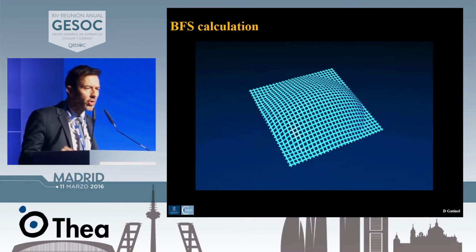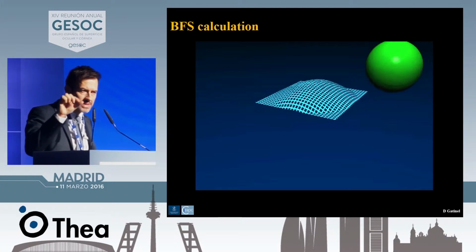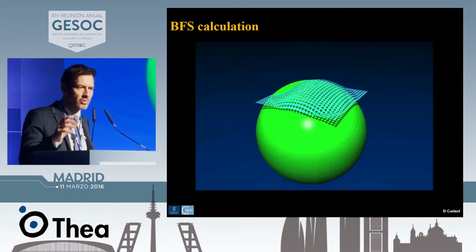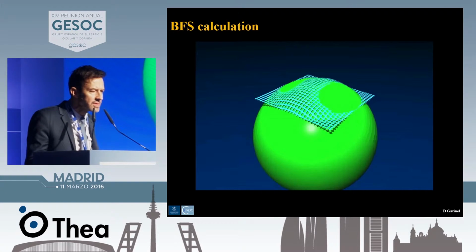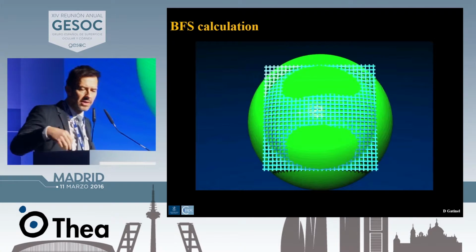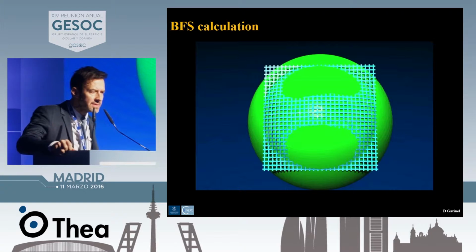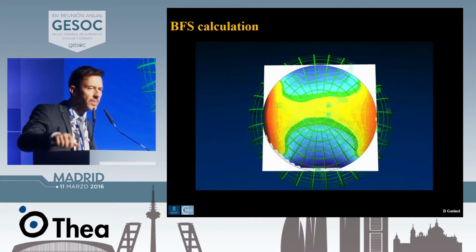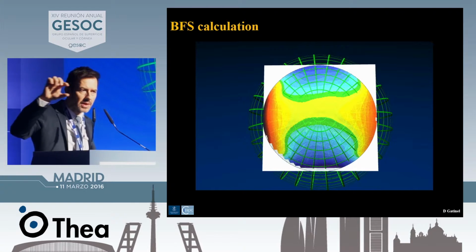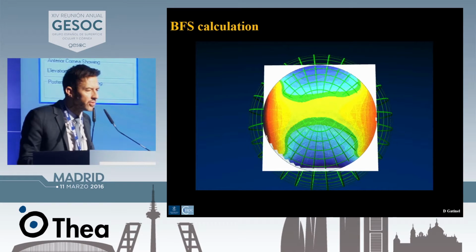If you have the shape of the cornea, the problem is to show it to the doctor because the differences are very small compared to the macroscopic shape of the cornea. This is why the best fit sphere, BFS, is always used to show elevation. Sometimes you can use other surfaces, but once you have found the closest fitting surface, you can plot an elevation map showing what is above the sphere in warm colors and what is below in blue colors.